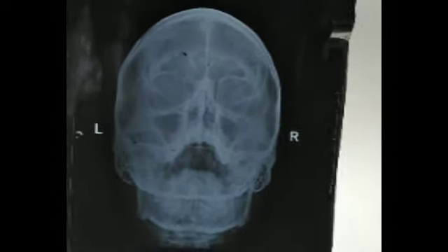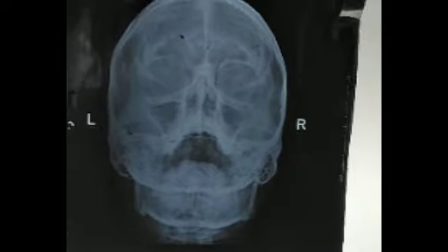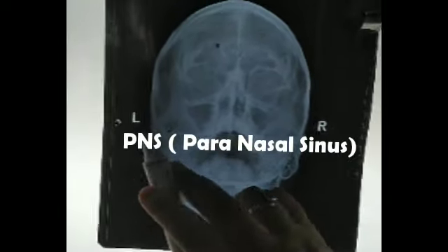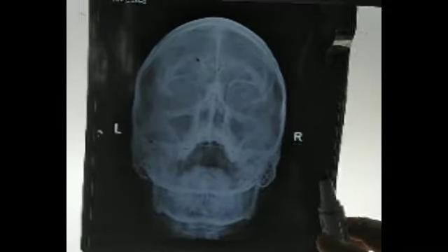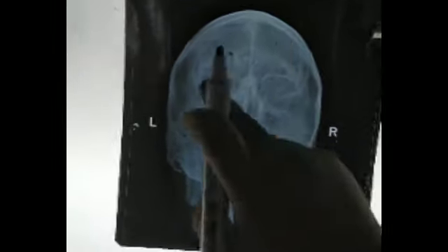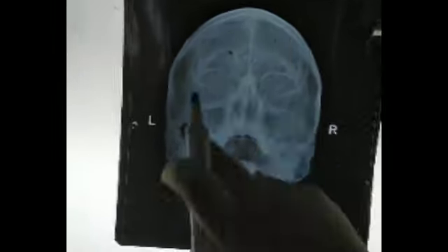Yes. So this is radiological anatomy, and you can see here the view is the PNS. The most important thing is you're going to put the left and right marker. Next, you have to check that in this particular area there should not be any metallic artifact or metal objects. Try to remove them.